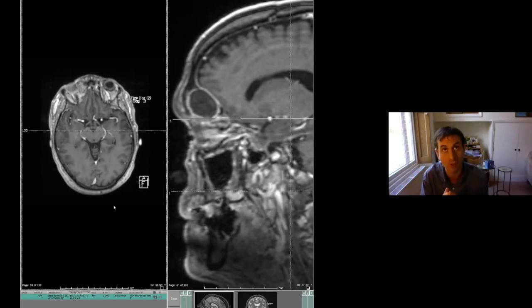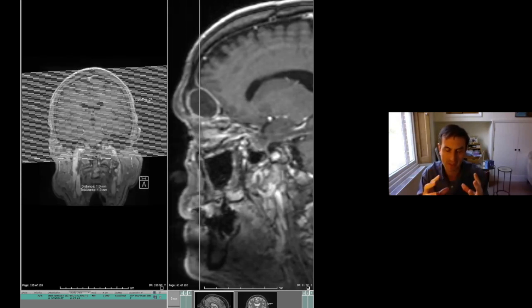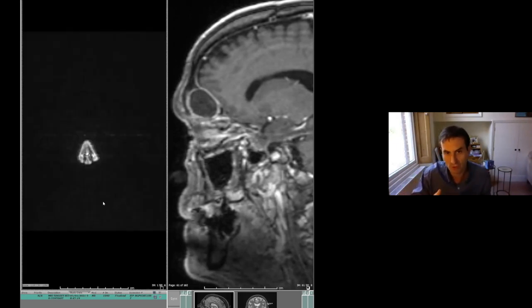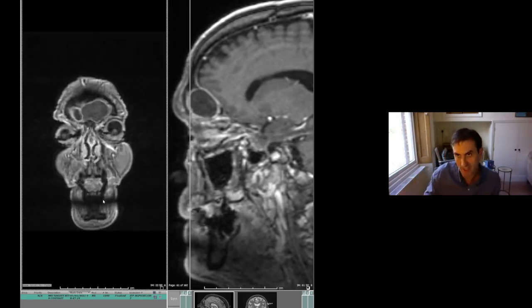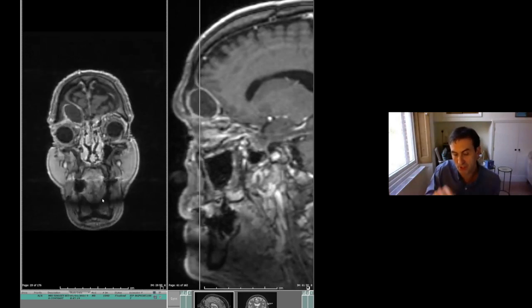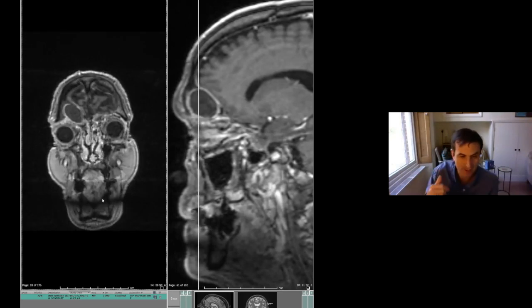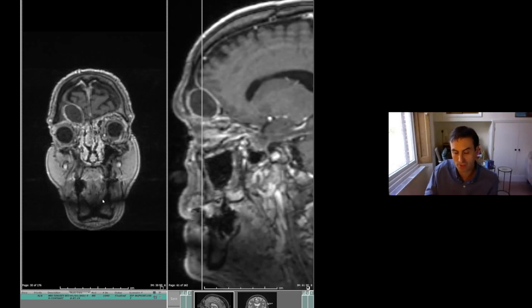One of the things, if you're dealing with a mucocele, is about having dependent drainage. And so this mucocele had essentially reaccumulated. As it did so, it expanded and eroded through the old passageway that the previous surgical approach had used, and therefore created a fistula. So suddenly this material was discharging out through the front wall of the frontal sinus over the eye.